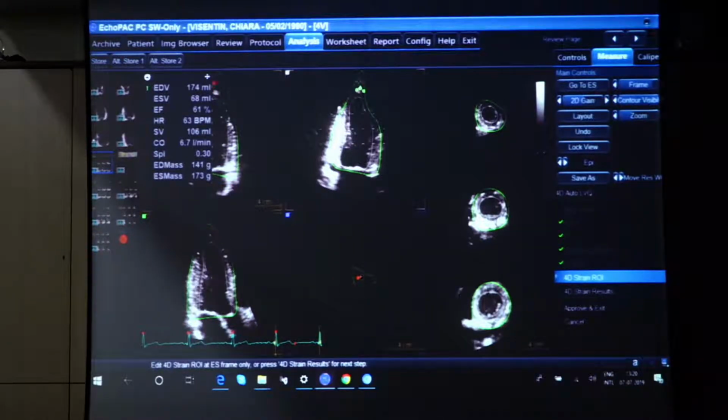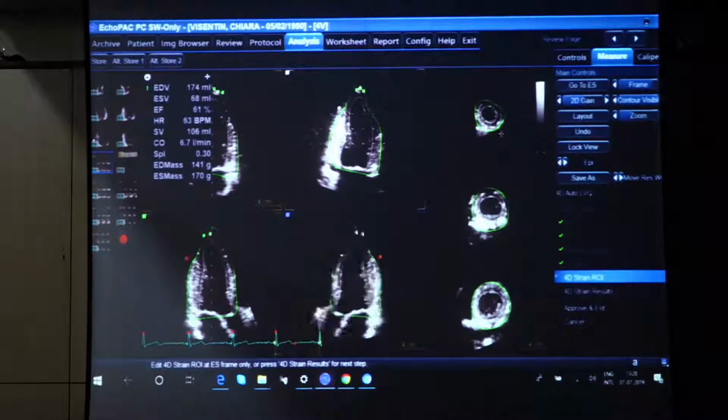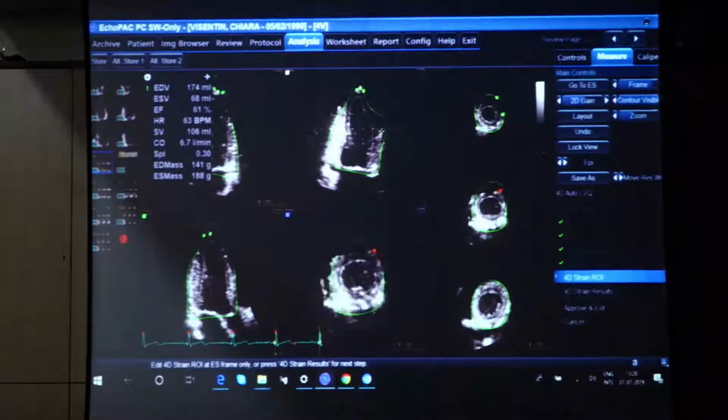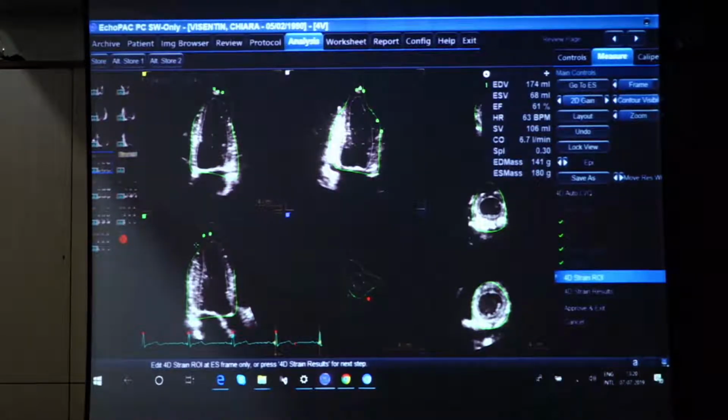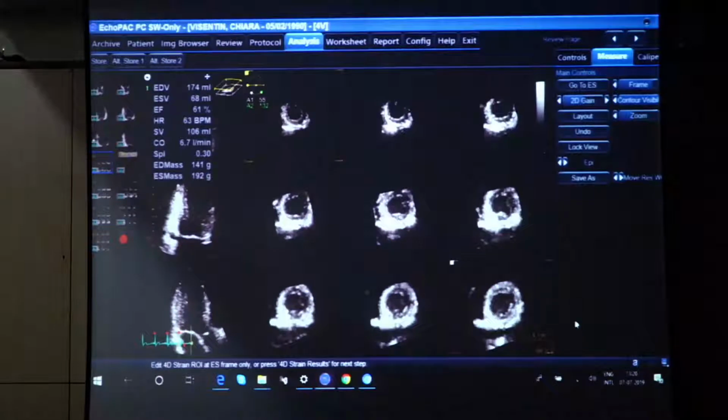It's gone crazy. I don't know why. Okay. There is something wrong over there. However, the concept is that one. I will do it for strain results in another. Do you have the same mistake in yours? No, it's just mine. So I will go back in a moment.